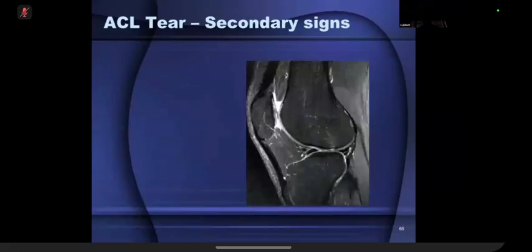So, anterior translation of tibia, because normally the ACL is preventing exactly that from the tibia going forwards, particularly coming downstairs. And when there's no competent ACL holding the tibia in its place, it tends to slip forwards. So if you compare, on the lateral side, you have to draw a line from the back end of the tibia and draw a line from the back end of the lateral femoral condyle. And the distance, if it's more than, some people say 7 millimeters, some people say 5 millimeters, I tend to rely more on the 7 millimeters rule. I call that anterior tibial draw present.